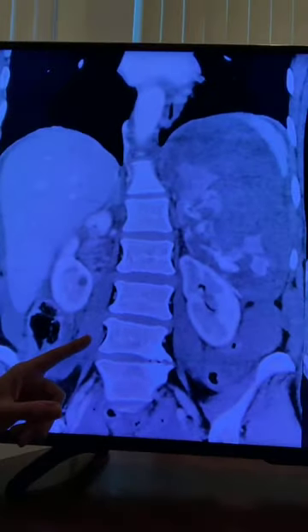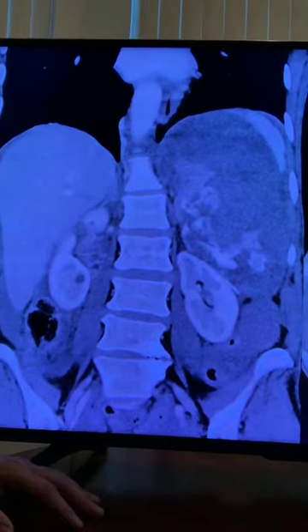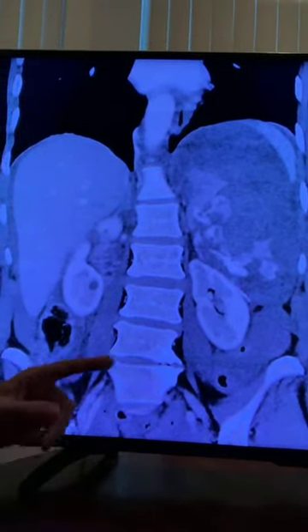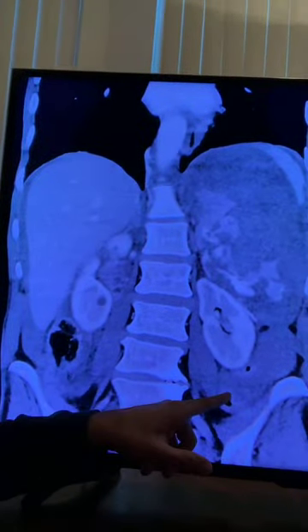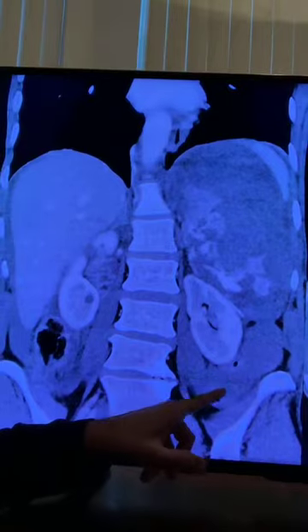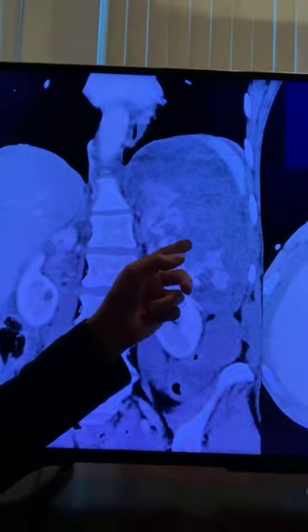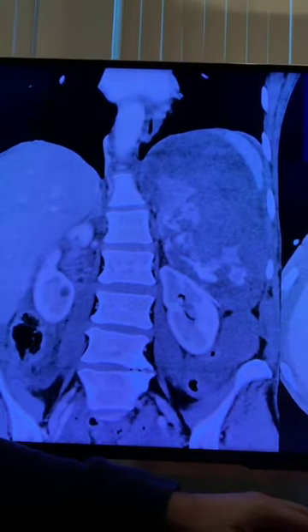They're really overlooked, honestly, on CT scans, but they're important when you look at KUBs. These are the psoas muscles. And then I mentioned the liver. I did not yet, but here we go. Here's a little bit of bowel and some bowel over here. And then what is this big old Goomba? What's going on here? Somebody already mentioned it before, right?